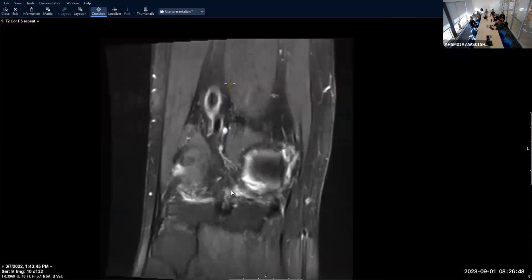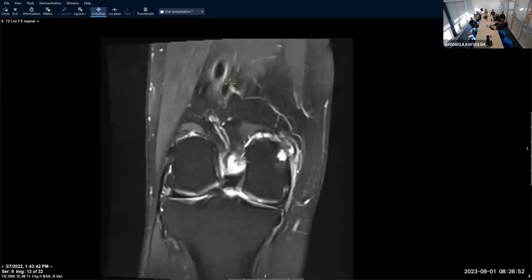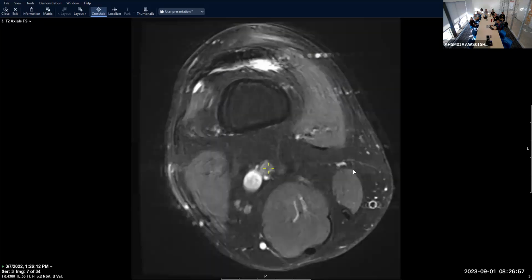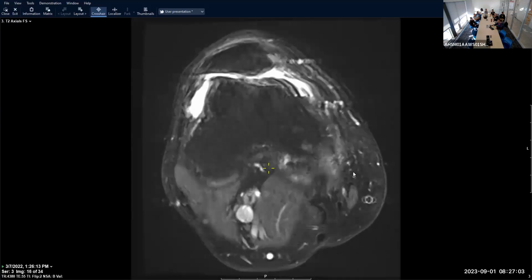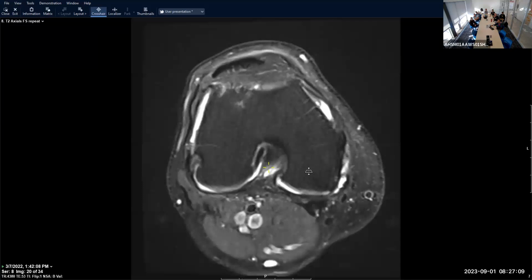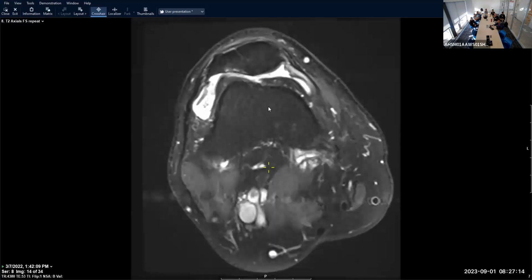A bunch of soft tissue edema near the medial gastroc origin is indicative of hydroxyapatite deposition. So I call this one calcific tendonitis, and just something to be aware of, because like the common things you're going to see, but sometimes maybe we're not thinking of it. It could be something you think of to figure out why your patient is having pain. We'll see a bunch of common things too here, but sometimes you got to think of some of the less common, or common but not in this general area.